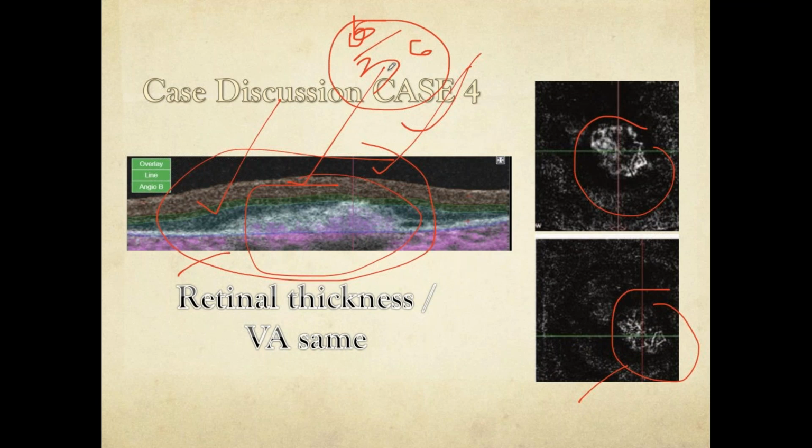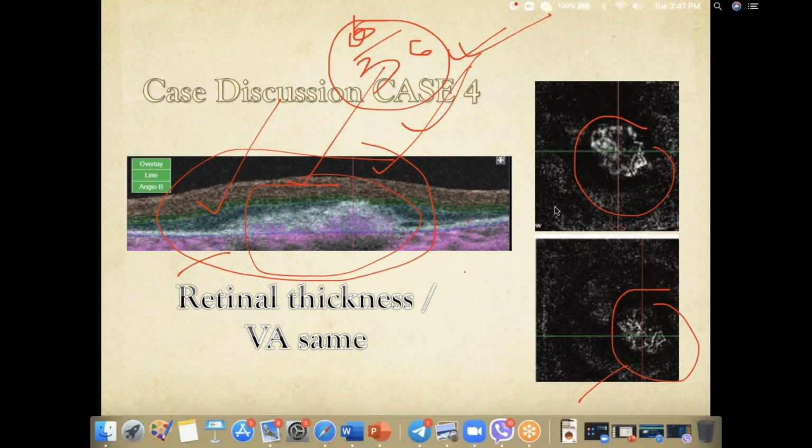But since we are doing an OCT angiography, and I'm seeing that although this looks normal, the CNV is slowly regressing, I would continue my anti-VEGF injections in such cases so that I do not stop the patient from receiving the treatment that he needs. Fine. So this is how OCT angiography can help in your practice.